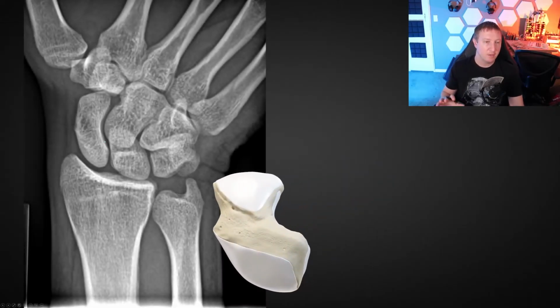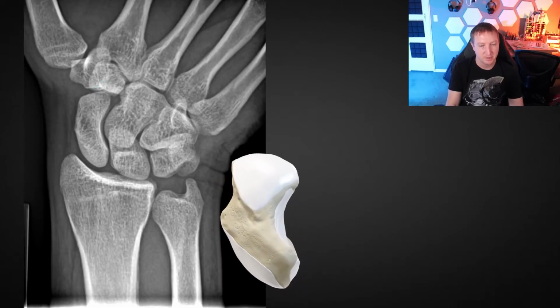All right, and so I mentioned, oftentimes we will do a supplementary ulnar deviation view, and part of the reason for that is that it allows us to see the scaphoid better. So this is the native position of the scaphoid, which I showed you on the first slide, where it's tipped forward a bit. But when we ulnar deviate, just physiologically, we apply stress and we pull it into more of an upright stance like this, and it allows us to see it much better and see the waist laid out really nicely, which is often the most common place we'll see a scaphoid fracture.